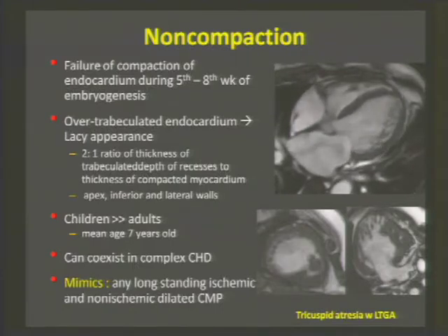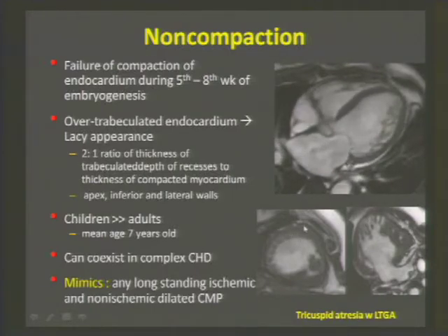You can see despite the fact that the left ventricle is doing all the work and it should be very diffusely hypertrophied, in that apex and anterior wall, it's very trabeculated and the myocardium is thinned out. For instance, here it should have been thick too, and it's thinned out. So you have the trabeculae and the thinning at the cost of the myocardium, where you can see the areas that are not involved.